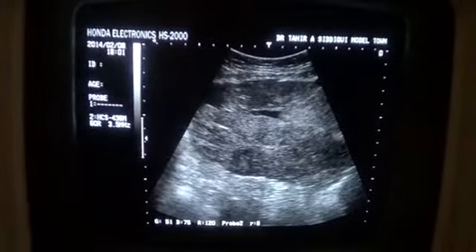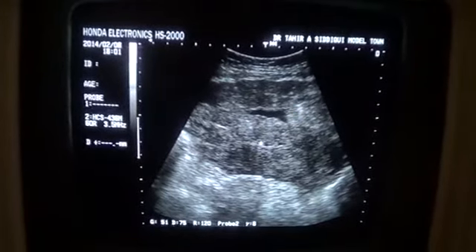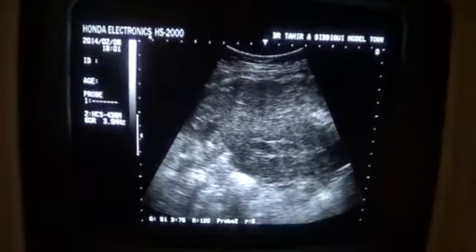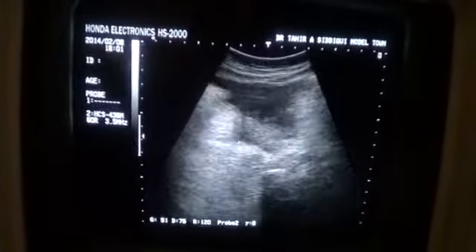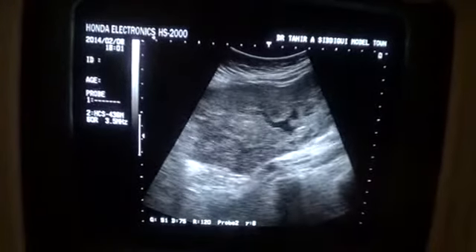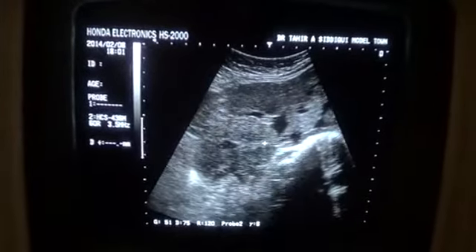Now this is the one. Now there are a few tiny calcified areas also seen within it. Concentrate on this region, and you will see a few calcifications in it as well. So either this is a bleed in process of being transformed into a clot.